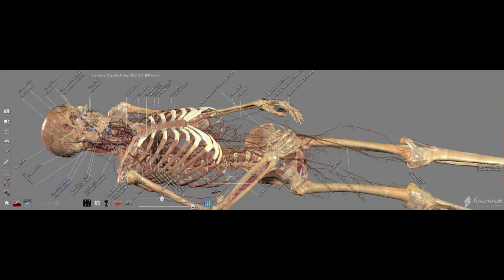So if we come up again, up either one of these common carotids, coming up your neck, just before you get to the angle of the mandible, they're going to split into your external and your internal. External carotids take blood to everything that's superficial around the brain. Think of the skull and the skin and the muscle in between them. Internal carotids are going to go towards the brain. If you look at the bottom of the skull, there are two large holes, among many others, called the carotid canals. The internal carotid arteries are what go through those. So again, you have the common splitting into external and internal.